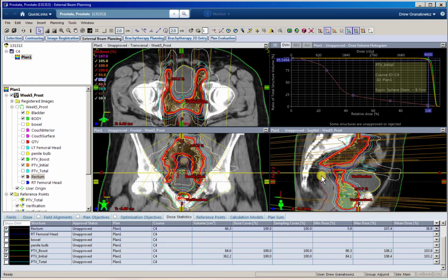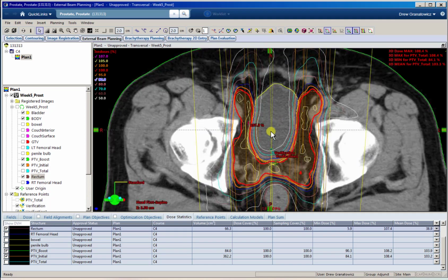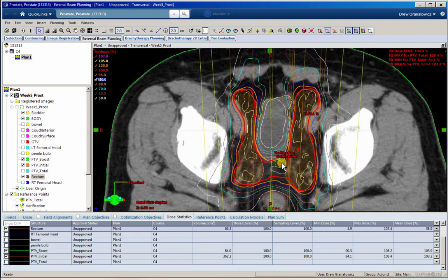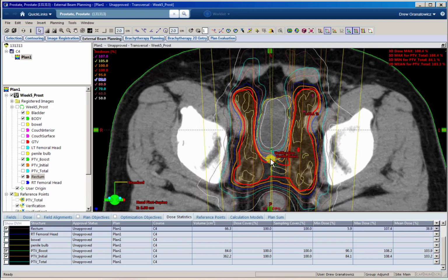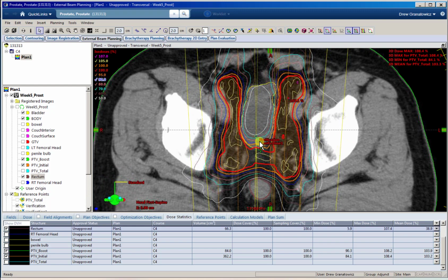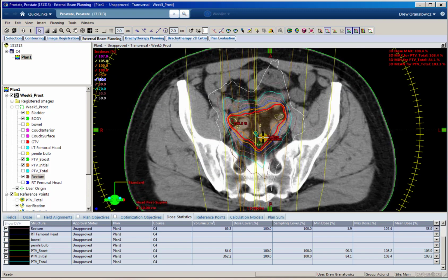If we look at that spot that looked like it was getting too much dose right here on our axial, the reason why it's doing that is because these targets are so close to each other. So we could try to get that dose out of there. Probably not a huge deal though if you leave it there. So if your plan looks like this, I think that's perfectly fine. We'll go over how to fix this issue in one of our upcoming assignments.